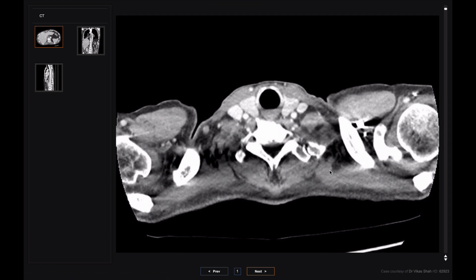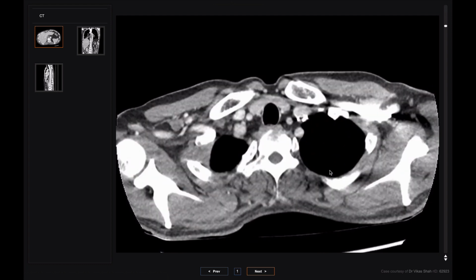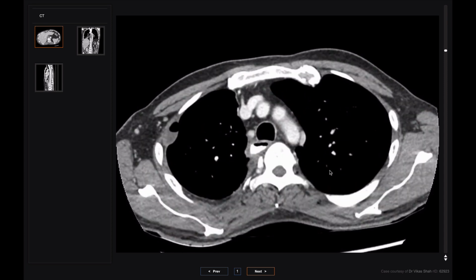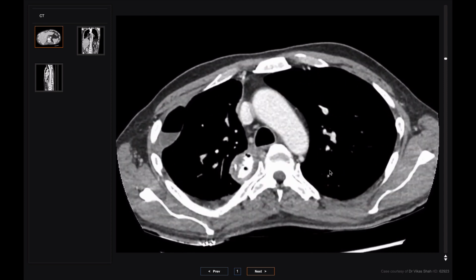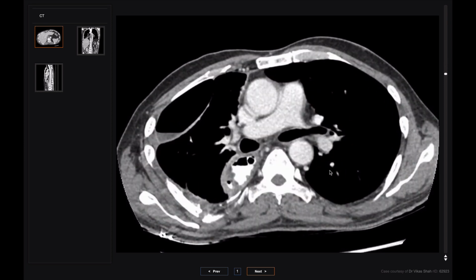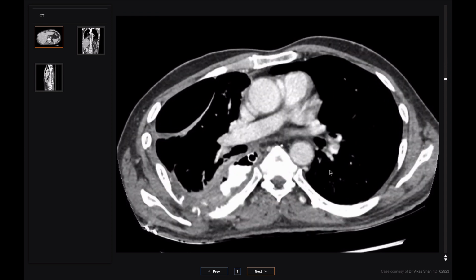So this patient had a gastric pull-up. So that's when an esophagectomy has been done and the stomach has been pulled up into the chest. But unfortunately, sometimes there are leaks from the staple lines, which happened in this case. And this was not the first scan this patient had. They've had a tube inserted into a hole in the staple line that was previously identified. And this study is really as a follow-up to see how well that hole is healing.